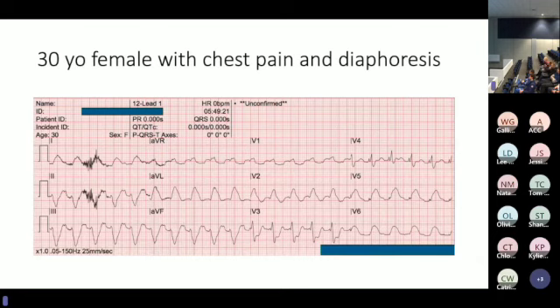ECG. But if you look at leads V3 and V4, what do you see there? Yeah, so there's ST depression in V3. I'm not as convinced I can see that in V4. So I guess V3 and V4 look more like narrow complexes with ST changes. So this patient actually has a massive STEMI, but because of the way the whole ECG looks, it looks like a broad complex.